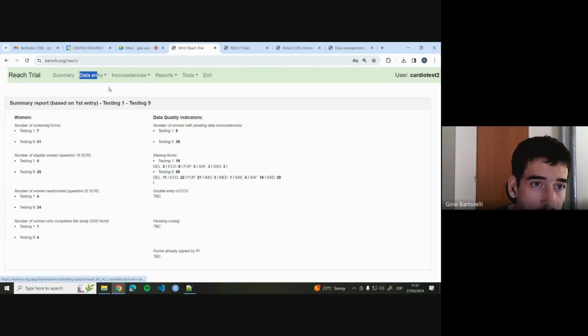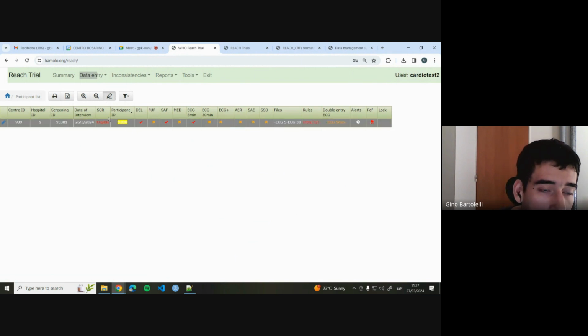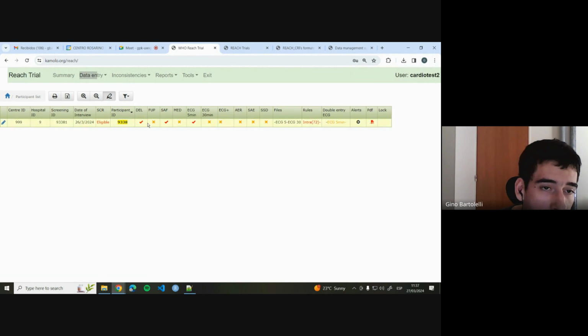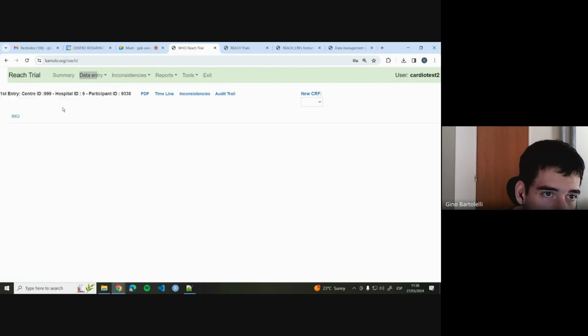So again, I'm going to go to the participant list. And here you see again the data corresponding to participant ID 9338. Okay, so if we get into the participant booklet, you'll notice something different.